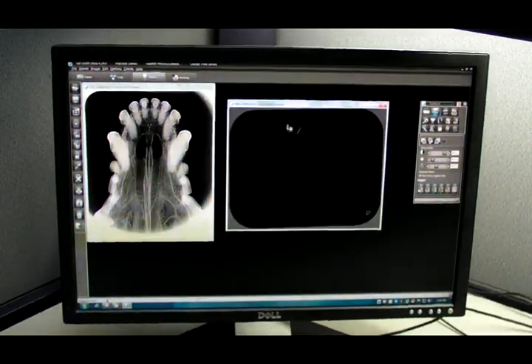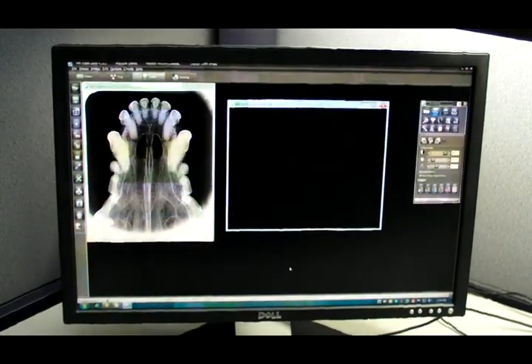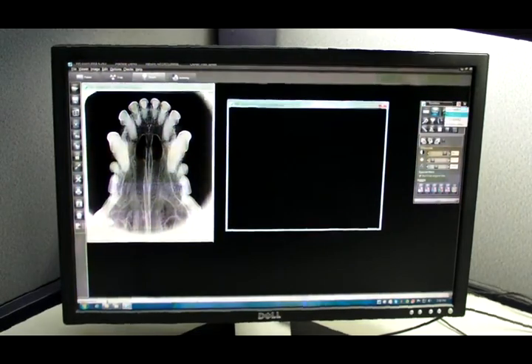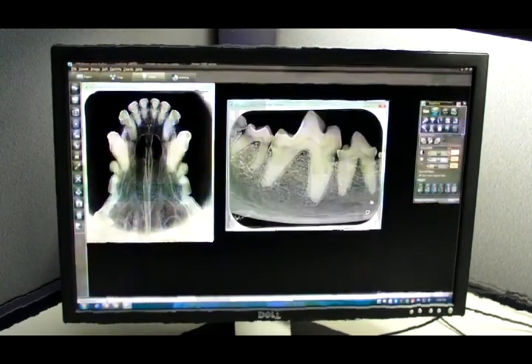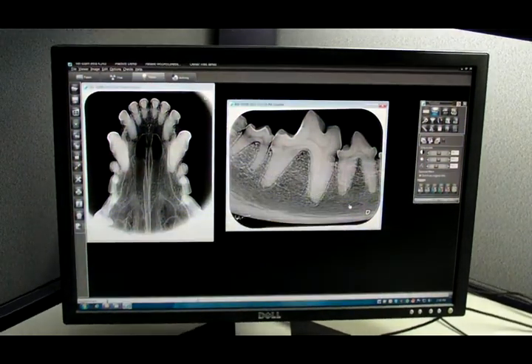If you mess it up completely and save the image, again you can still go back to first saved and resave it. So once you're in the viewer, whatever you do, you can always go back to first saved.